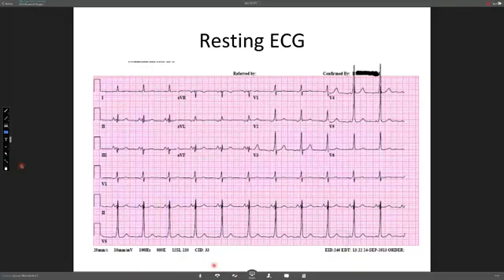So you made a decision to do an EP study and ablation based on symptoms of palpitation. So this is a WPW pattern EKG plus symptoms, so it's WPW syndrome. And I think it was the right decision to do an EP study. But what if the patient doesn't have symptoms? A lot of times we get consults for incidental finding of WPW pattern EKG.